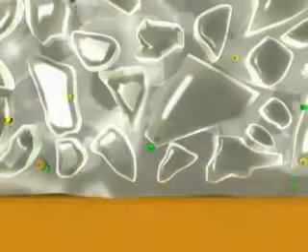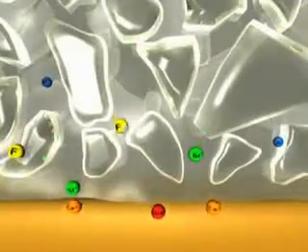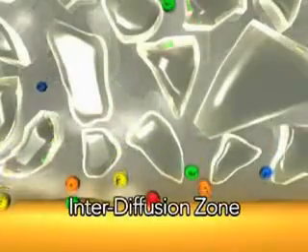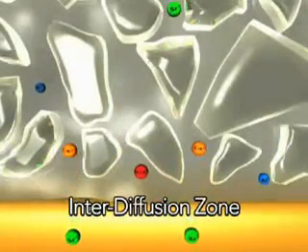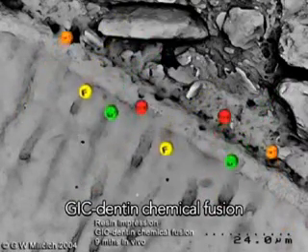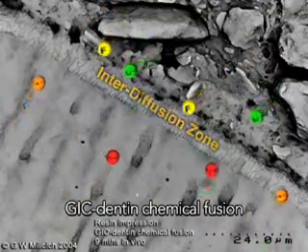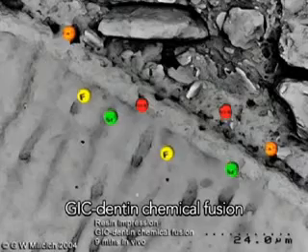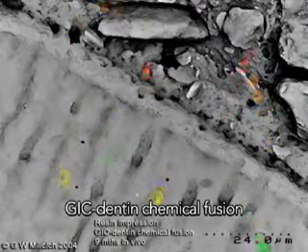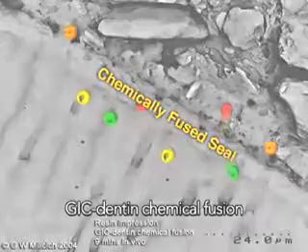Calcium and phosphate ions from the polyacid-treated dentin and enamel, and strontium and fluoride ions from the unset glass ionomer intermix and precipitate, forming an interface called the interdiffusion zone. This zone is stronger and more acid-resistant than either the glass ionomer or the tooth. The combination of the interdiffusion zone and the chemical bonding provides the basis for a strong, stable adhesive interface and creates a bacteria-proof seal for the cavity, best described as a chemically fused seal.